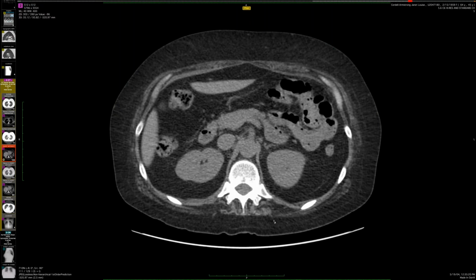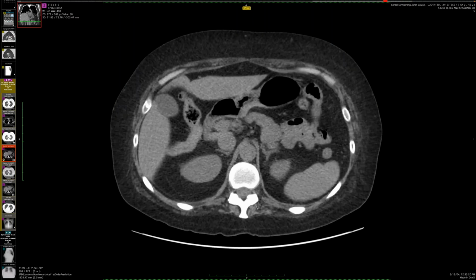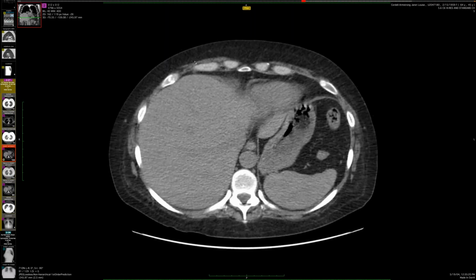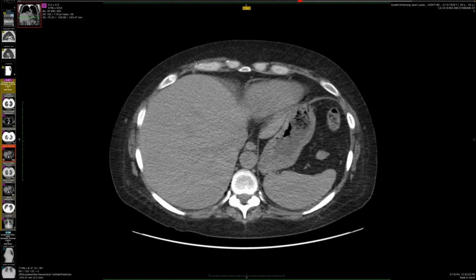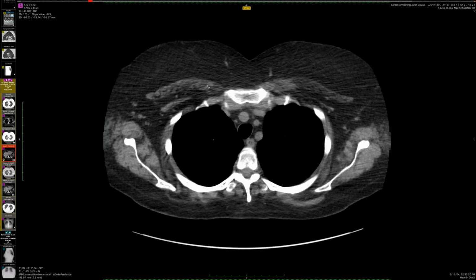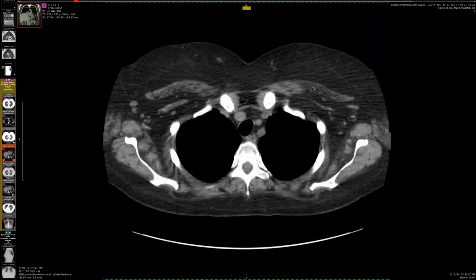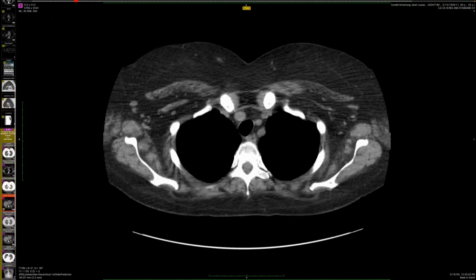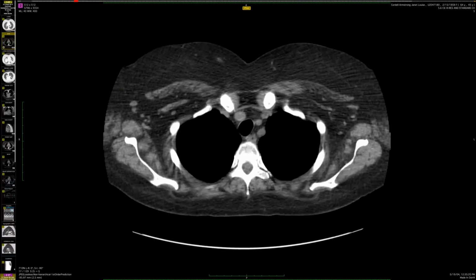And this condition persists. Notice the atrophy of spinal muscles here. All of the thoracic muscles have fat infiltration. They're speckled with fat, and they're pretty scrawny. And the pectoral muscles also contain a lot of fat. So this is part of this lupus myositis that this person has. And things are only worse now.